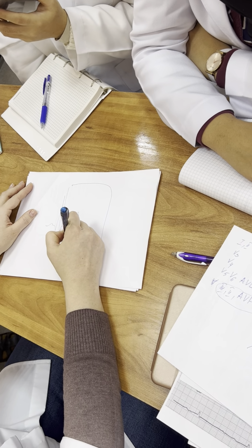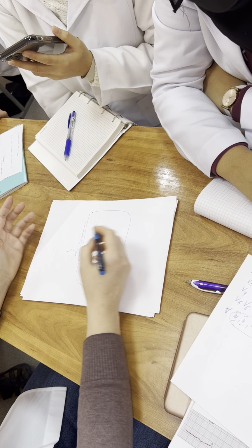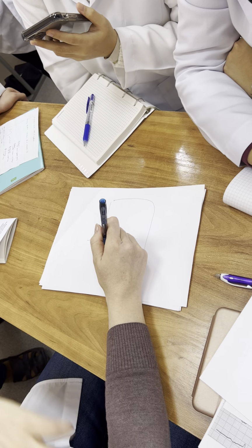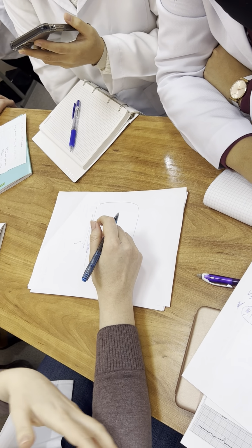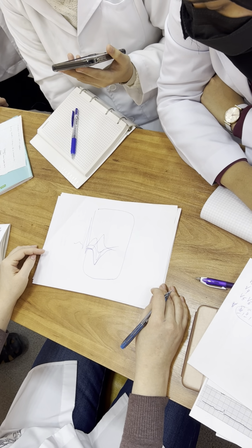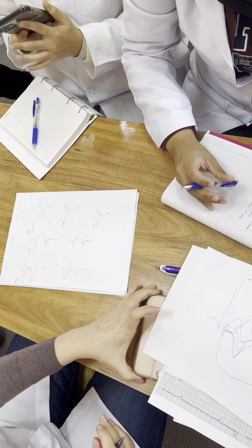Maybe ST depression, negative T. Maybe plus-minus T. Maybe only ST depression, but lasting more than 30 minutes. If we talk about angina, less than 30 minutes; MI, more than 30 minutes. So, non-specific changes. You should know everything about your patient. Understood? About ECG, that's all.